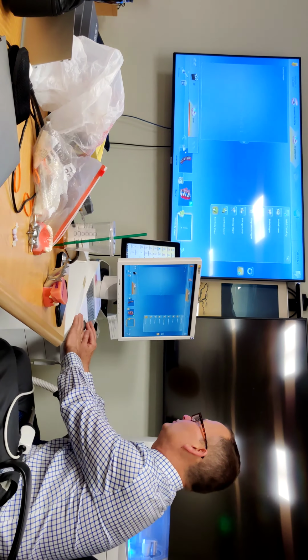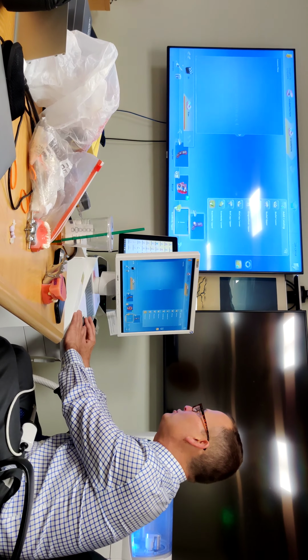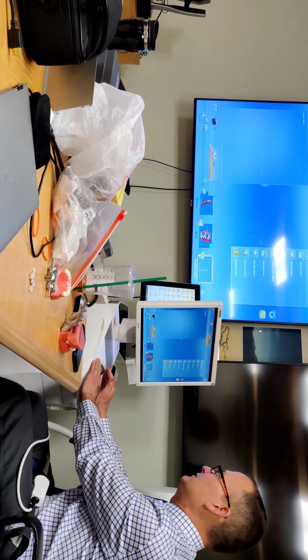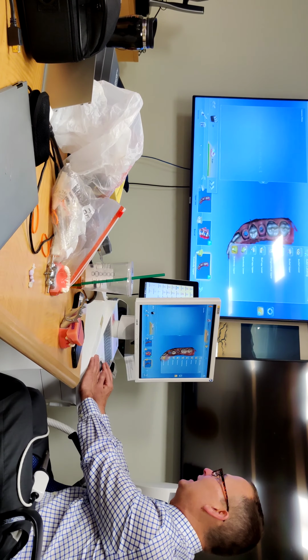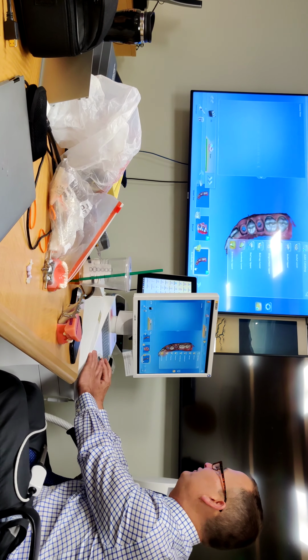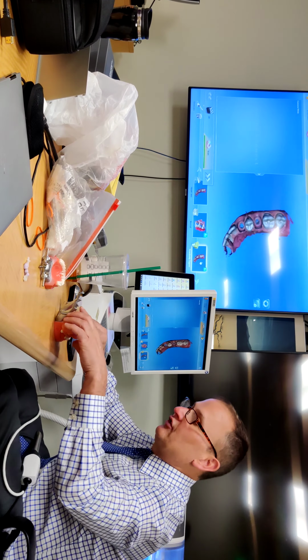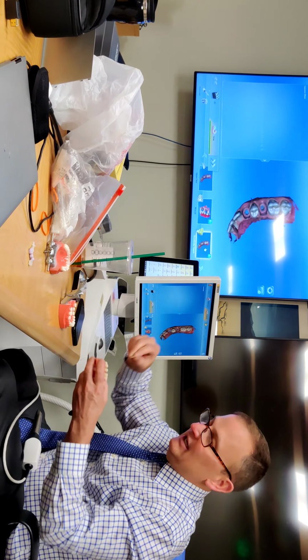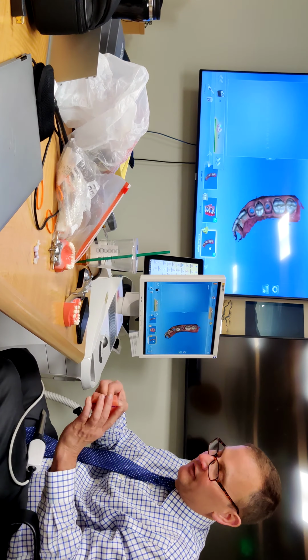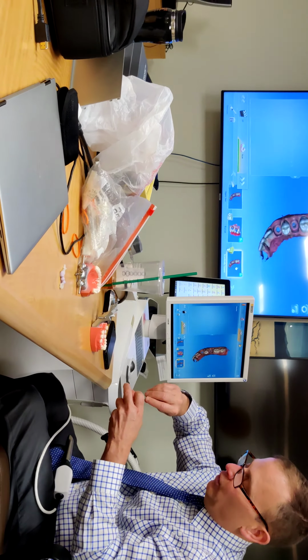Now, this is upper. I'm not going to rescan. I'm going to bring this over, and do I want to move it? No, I want to copy it. Okay, so now I've copied. Saves time. I've got both catalogs filled, but this scan body one does not have the scan body in it. So let's put the scan body in. If y'all have seen the EV scan bodies, they only go in one way, just like the Atlantis abutments do. So you rotate it around till it drops in place, and then you hold it down and tighten it.